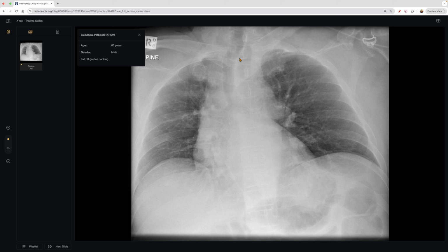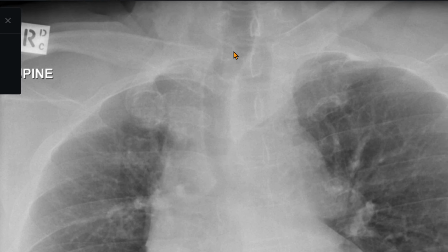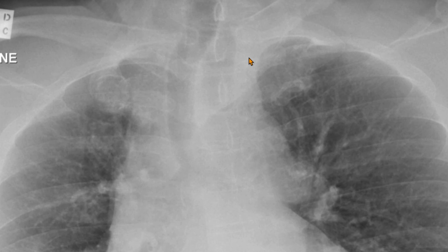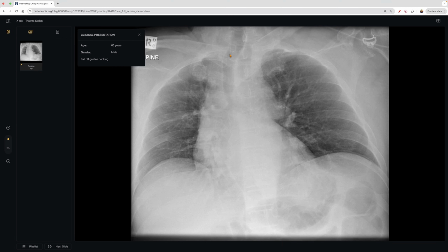And how do I know that? It's because we look at the clavicle, right? The medial aspect here, you can see a little bit difficult to assess. Maybe if I zoom in a little bit here, you can appreciate the border there versus on this side coming off there. Let me back up. And so what happens is they're supposed to be equidistant from the spinous process, which are these little notches in the background, and that's going much more posteriorly, by the way. So they're supposed to be equal distance from each other. And you can see here, it's actually further to the right.